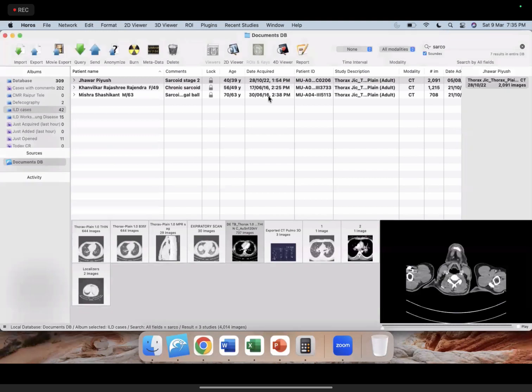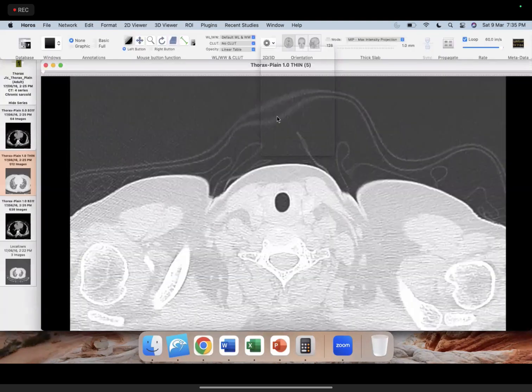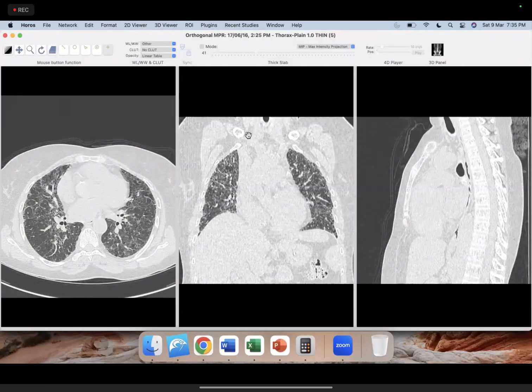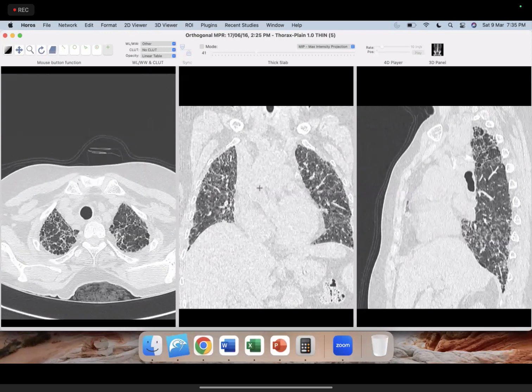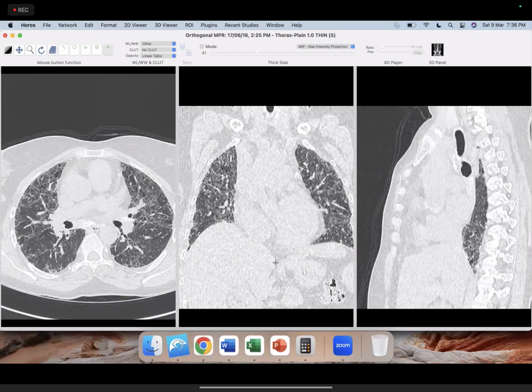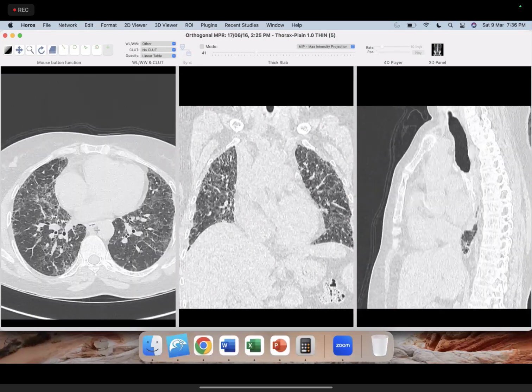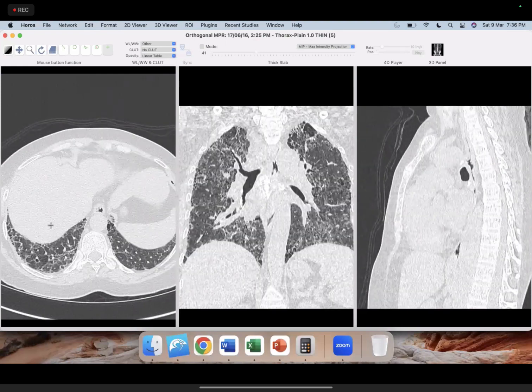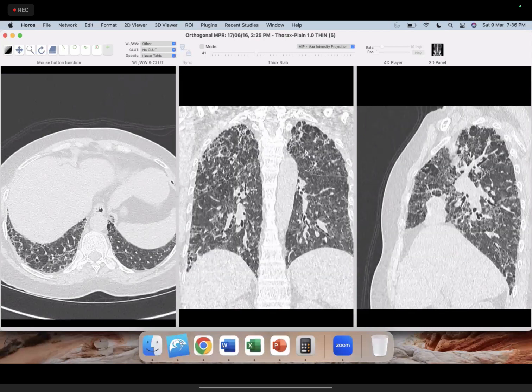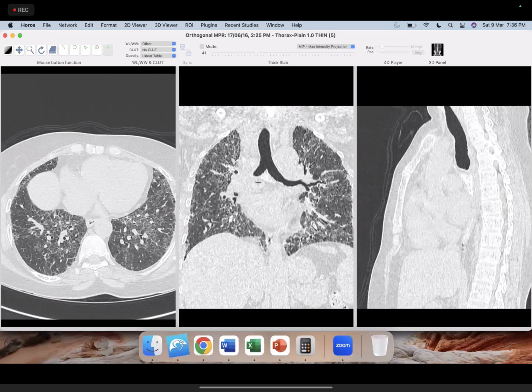Then I have one more example for advanced sarcoid also, because every time it's not so simple. Yeah, so this example, what do you think? So this is reticular opacities. Again, if you appreciate, there is a significant bronchocentric involvement. It's not only subpleural. And now can you appreciate this is a homogeneous appearance, without any gradient, right? You see sagittal, you see coronal, you even go from axial. The upper and lower lobes appear to be almost equally involved. So these are all your signs going against the typical UIP pattern. Now you are left with non-IPF.